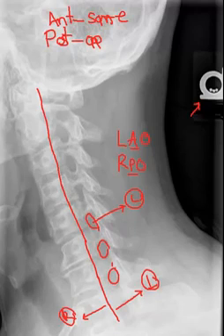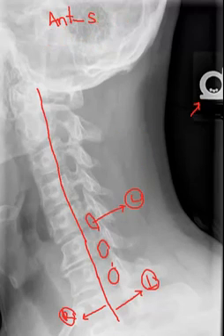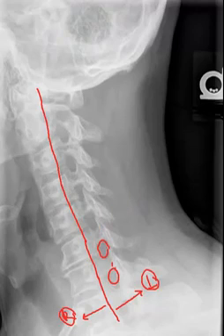But the most important thing clinically is just to realize which side the IVFs are being visualized. I'm just going to clean up our screen a little bit here. Okay, so these are the IVFs. Now I want to draw your attention to the margins of the IVFs. Notice that the roof of any particular IVF is this little linear structure here. This is the pedicle. More specifically, this is the left pedicle.